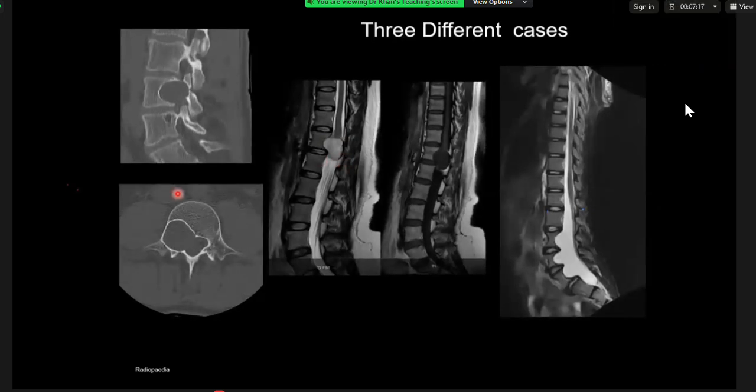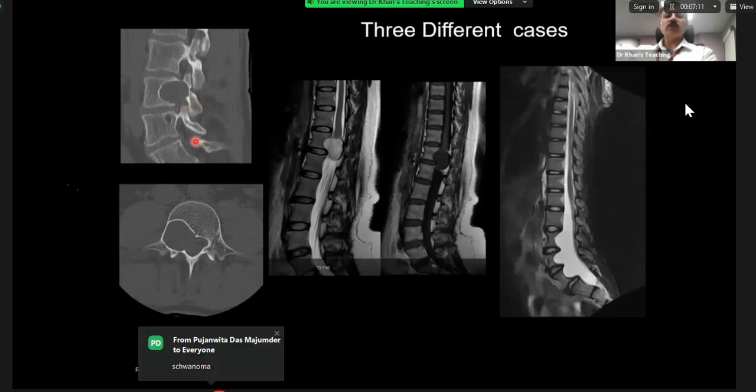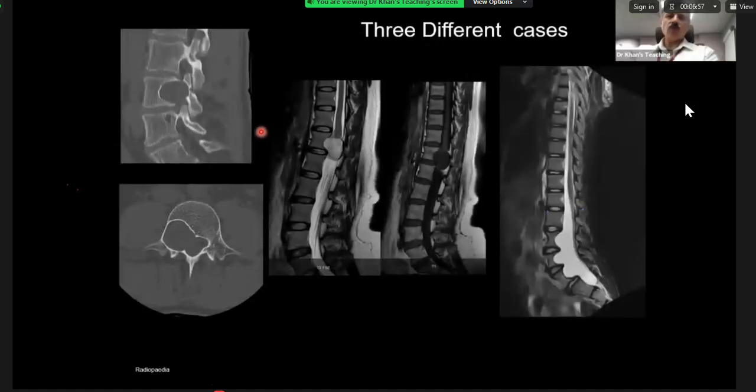Yeah. This case, again, it is similar to this case, but this is a CT scan. It is not the same case. And it is also schwannoma slash neurofibroma. Of course, you don't have evidence more than that. Okay, right. Actually, this was the last case of the day.